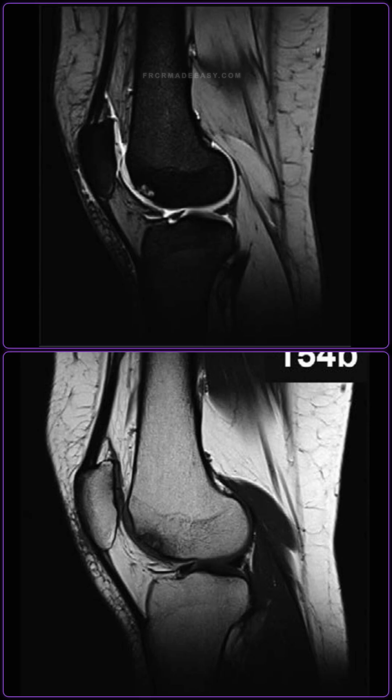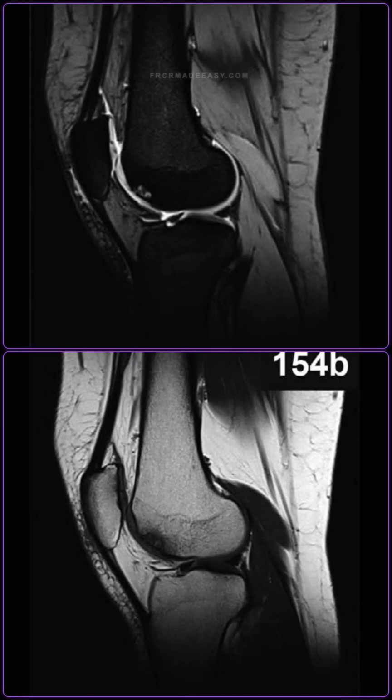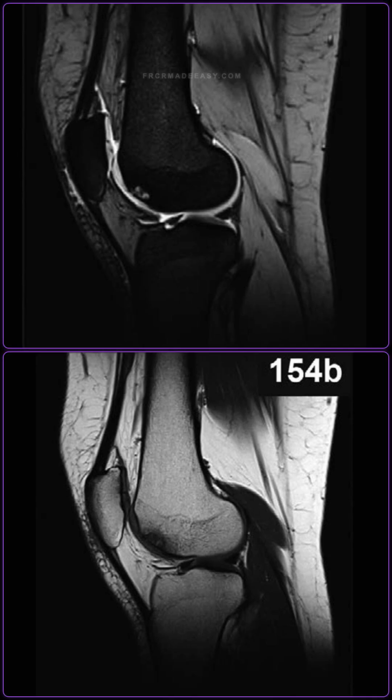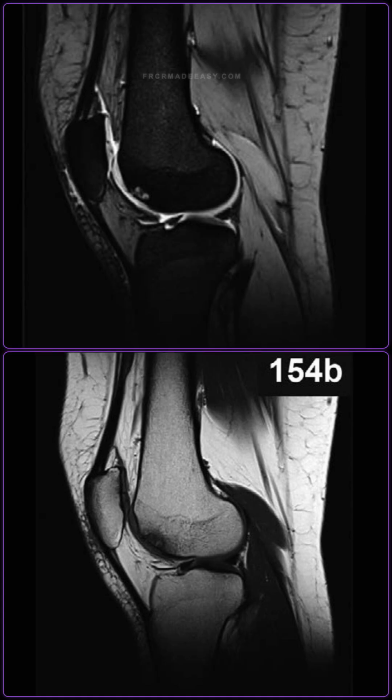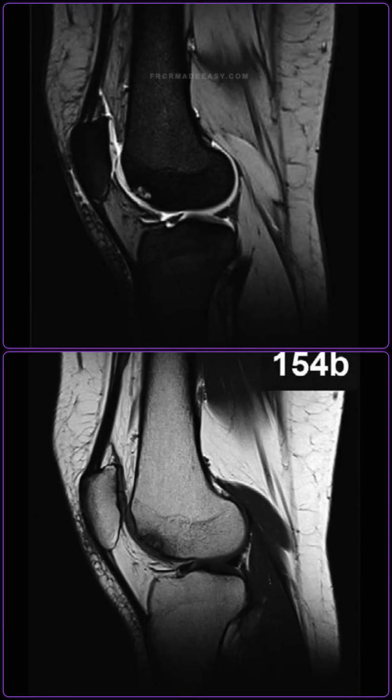Features of instability include a high T2 signal fluid line tracking behind the fragment, multiple subchondral cysts beneath the lesion, cartilage breaches, or a focal fluid-filled osteochondral defect. If these signs are present, the fragment is considered unstable and prone to mechanical displacement. How would you manage this patient as a radiologist?